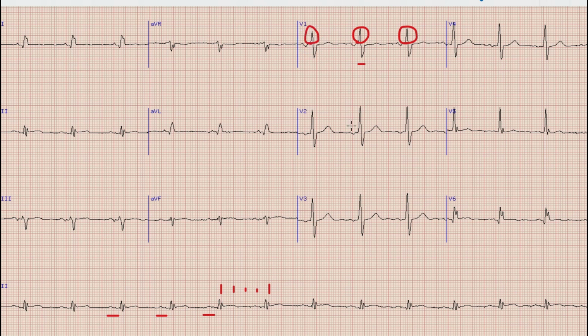Normally, in healthy adults with properly placed leads, we do not get an R wave which is more than or equal to the S wave. There are multiple causes of a prominent R wave in lead V1, and we will discuss them one by one.